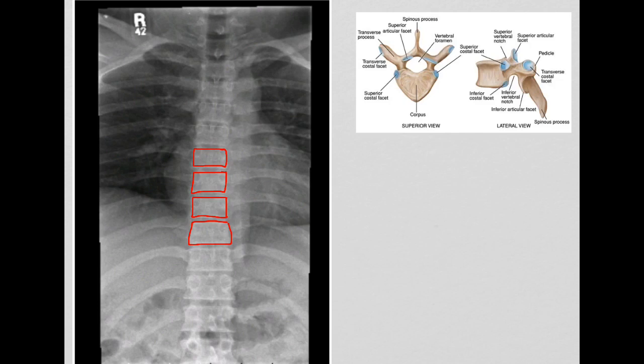The most accurate method is to identify the first rib, and we do that by looking at this C-shaped structure up here. We find it up here near these clavicles. Here's our clavicles here. And right around that area, we are going to find this C shape and follow it around. Now, if you look at where this starts and stops, here's these wings here, which are transverse processes, and they follow along here.